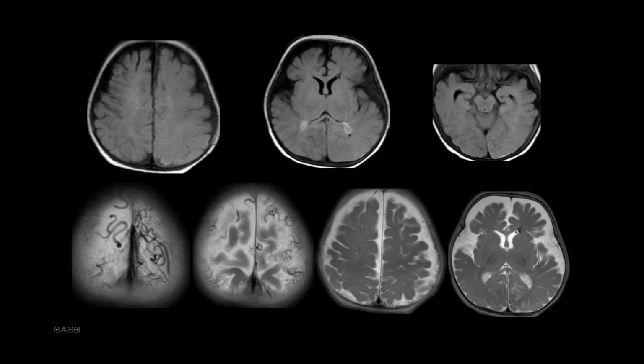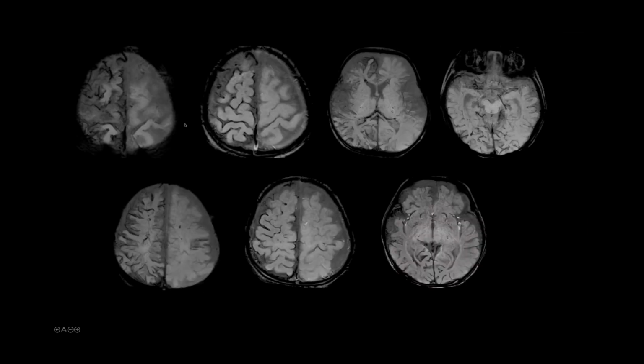Some areas of hypointensities in the left anterior periventricular region, possibly prominent medullary veins. Tortuosity of the superficial cortical vessels on both sides, and also along the lateral and posterior convexities. The gradient images demonstrated further calcifications along the right cerebral hemisphere and also in the left paracentral region.